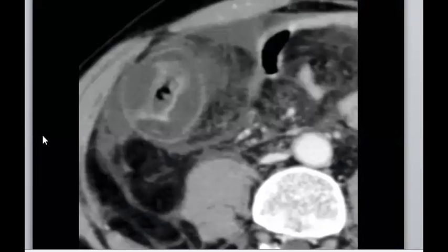When you find thickening, try to localize which site it is. I think now we are talking about the colon, so we are in the cecum. Search if there is any involvement of the terminal ileum. Then the age of the patient can also help you. So typhlitis is a good option. What is typhlitis?